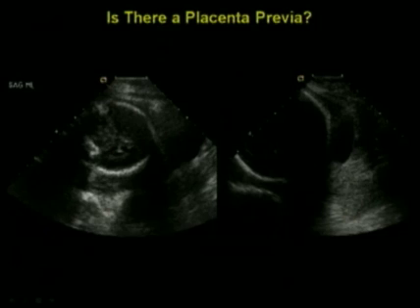So what can we do if the head shadows out the cervix? Well, here you can see two images, two different pregnancies, two different fetuses. In both cases, the head shadows out at least part of the cervix. These are transabdominal views. There's the fetal head, it casts a shadow down here. The cervix would be somewhere around here. We have no idea from this image whether there's a previa or not.